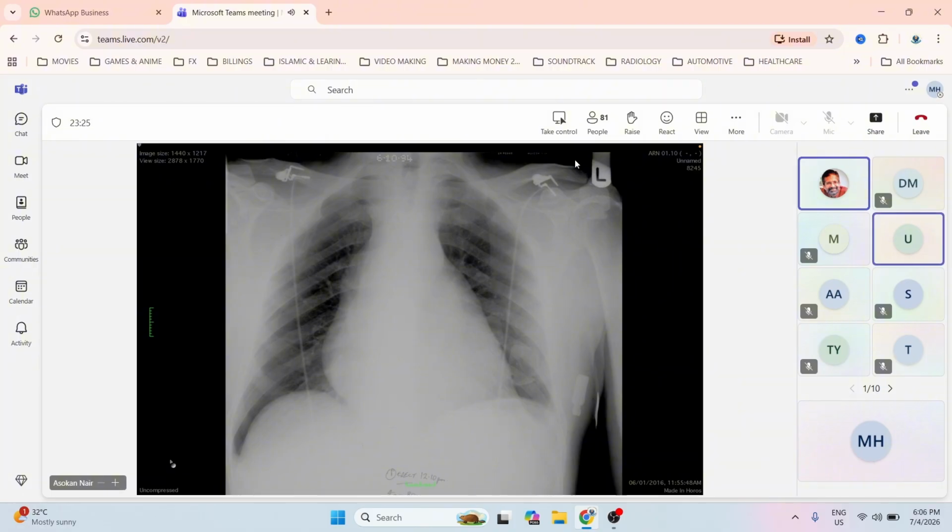All right. So what happens is most times in the exam, you have a tendency to give a differential diagnosis which does not fit the image. I agree with you, all the differential diagnoses you gave are causes of a grossly enlarged heart. Yes, but it does not fit in this particular case. So don't do that in the exam, not in this case or even in other cases. If there is a spot diagnosis, it cannot be anything else.